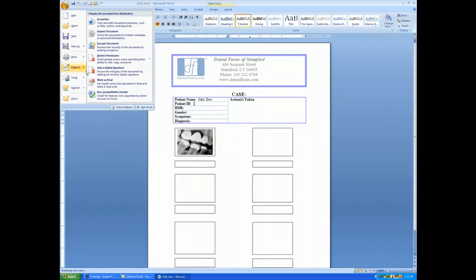So this can be a very powerful and useful feature. By making up the provided templates, you'll also have an idea if you want to make up something custom. You can make up any number of different templates and add them to your folder of templates, and they will always show up under that ProImage tab when you want to launch Word and do case referral studies.